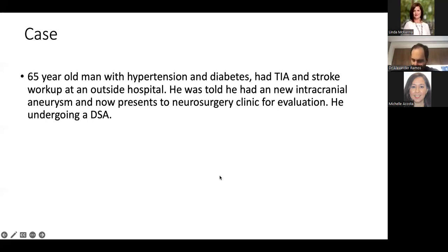So what I didn't show, but what you always have to check, is you do an angiogram of their brain, and you see where the normal venous blood is flowing. And in patients with high-grade fistulas like this guy, we say that the fistula hijacked the sinus. So the only thing that the sinus was draining was the fistula, not normal brain.